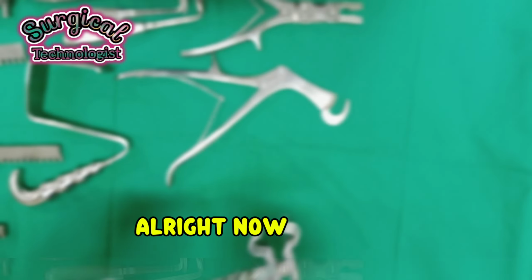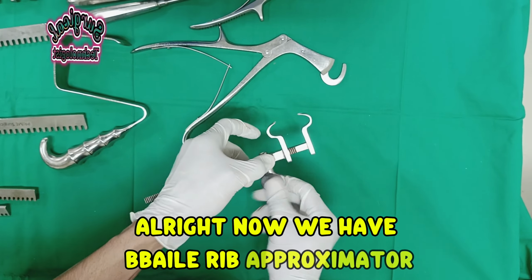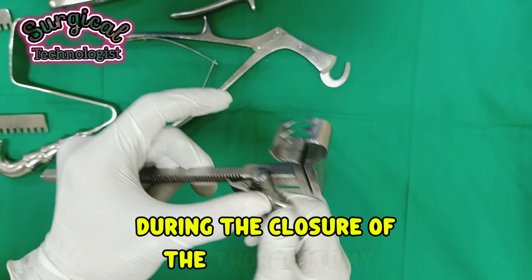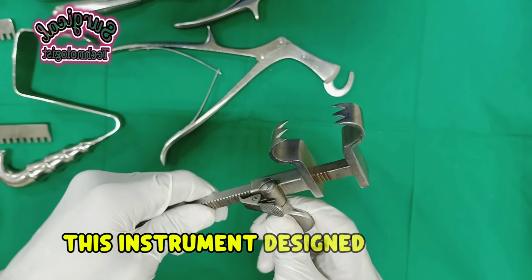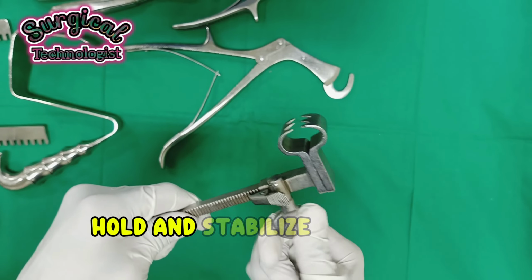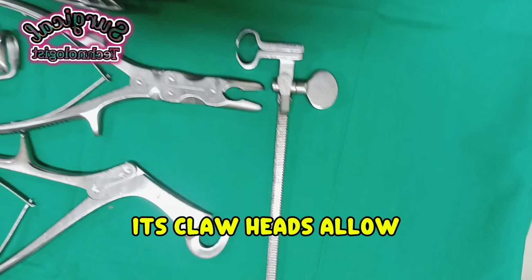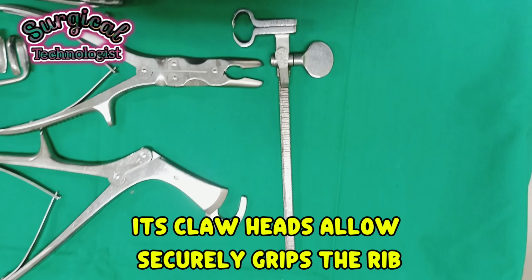Alright, now we have the Bailey rib approximator, typically used during the closure of thoracotomies. This instrument is designed to bring, hold, and stabilize separated ribs together. Its claw heads allow it to securely grip the rib.